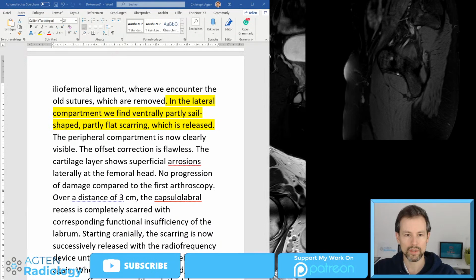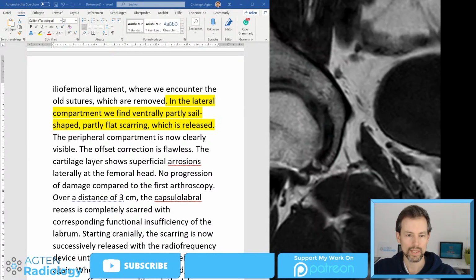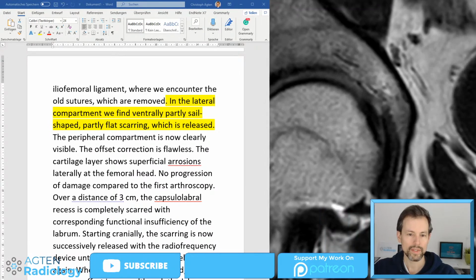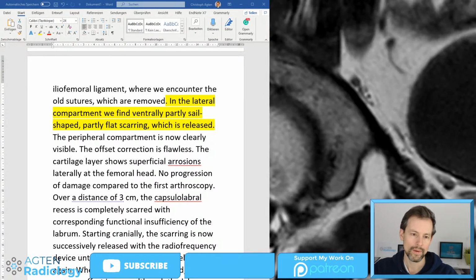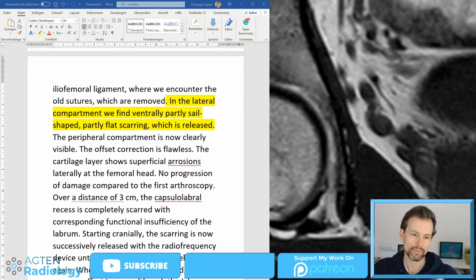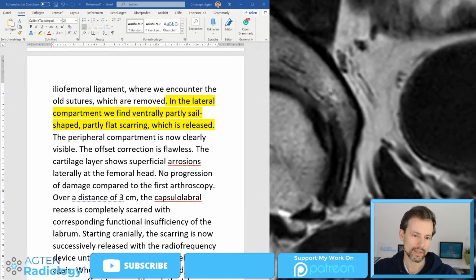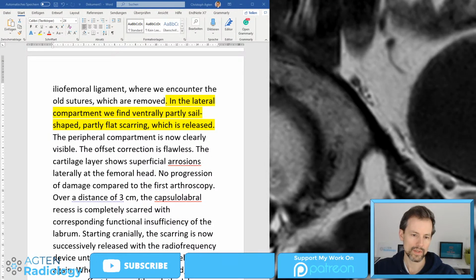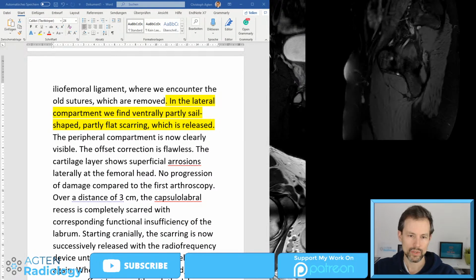So that would most likely be the very most lateral portion of the femoral head. I think this is probably not easy to see just based on resolution. I noticed over the last couple of reports that I read that they sometimes see quite long erosions at this most outer portion, and I really struggle to see this on MRI.